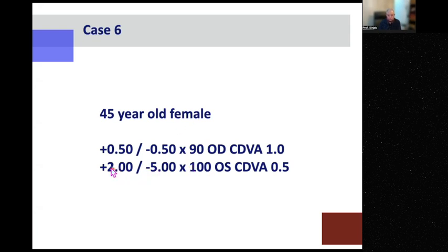Now, what about this? Is it myopic astigmatism or hyperopic astigmatism or mixed astigmatism? Mixed astigmatism. Now, how about the age? 45.